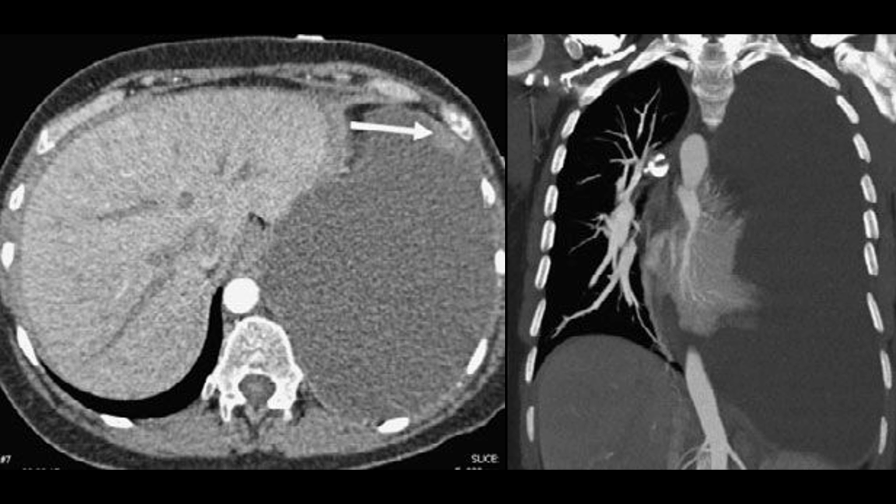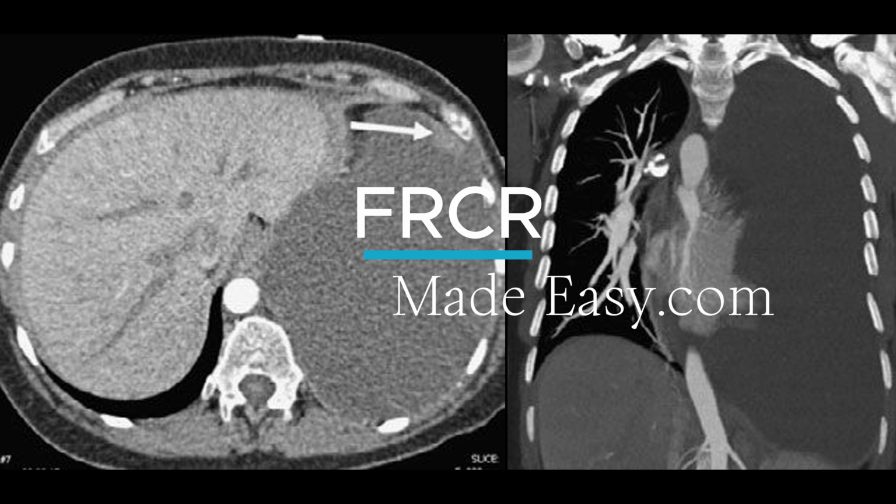If stable, further characterization with CT is appropriate both to confirm the extent of the effusion and to look for underlying pleural nodularity or thickening suggesting malignancy, as well as to plan thoracostomy tube placement. A decubitus film with the affected side down can help determine whether the fluid is free-flowing or loculated, although in a large effusion, there may be little positional change.